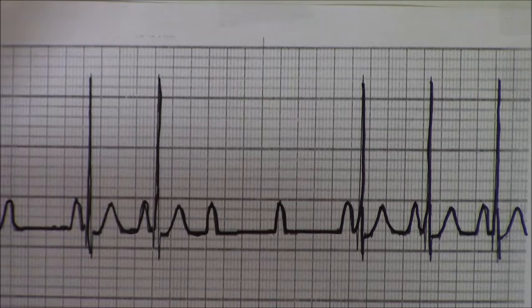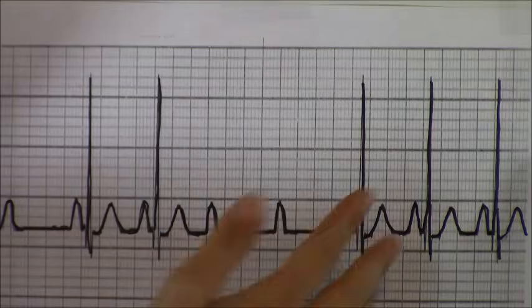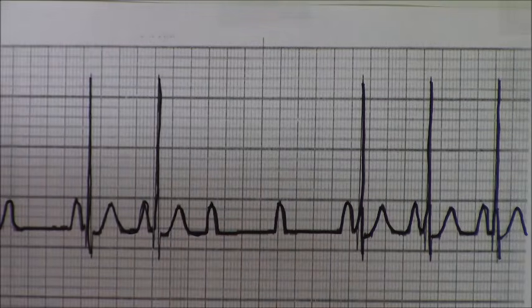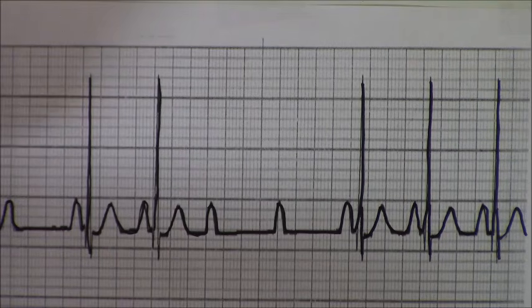Okay, so very first thing we want to do, we're looking at the rhythm, and of course it looks, hey, something's abnormal. We got P waves all over the place. We got missing QRS complexes. We know that something's funky about it. I'm thinking heart block, but in order to solve it, let's do our 5 steps together.